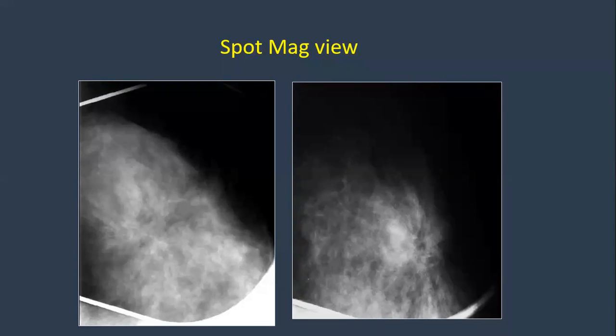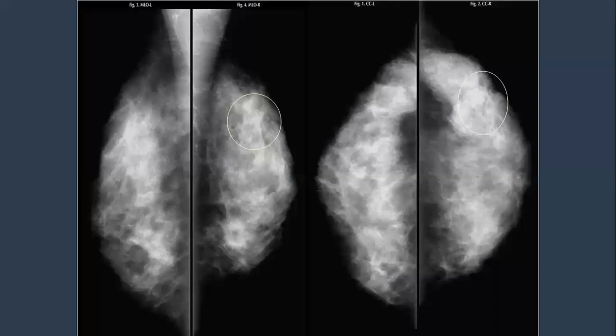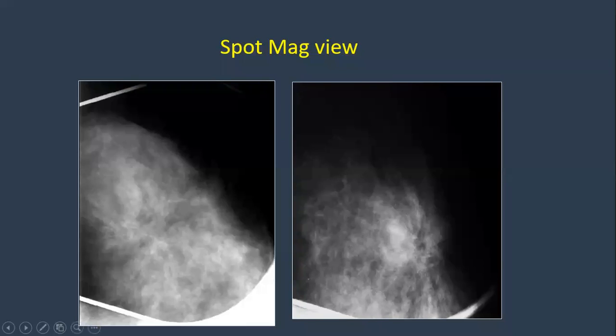I did not see radiopaque clips to make sure this is a site of biopsy. But there is a skin change, if you look here, and I have to ask exactly where the site of previous biopsy was. That was the site of previous biopsy.